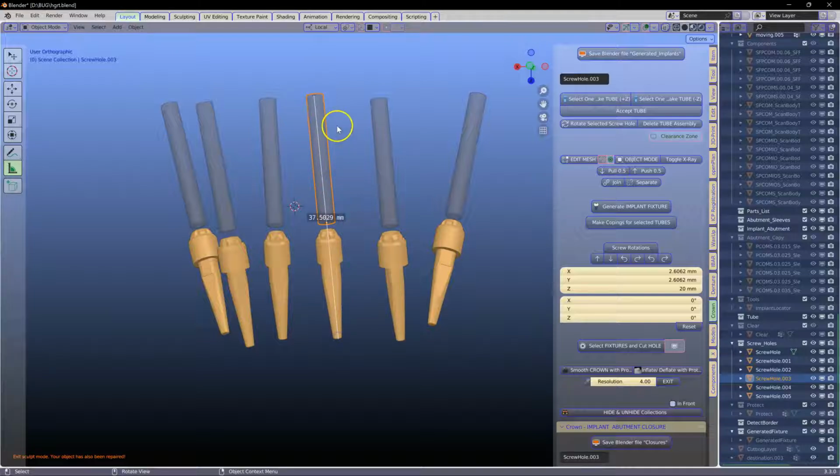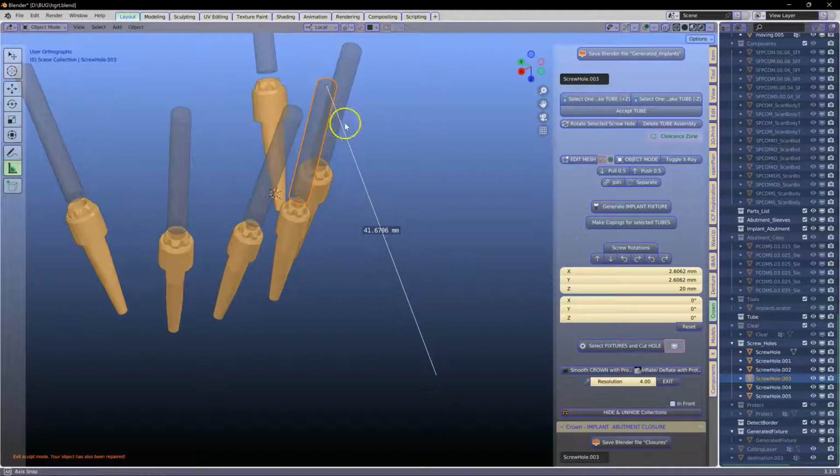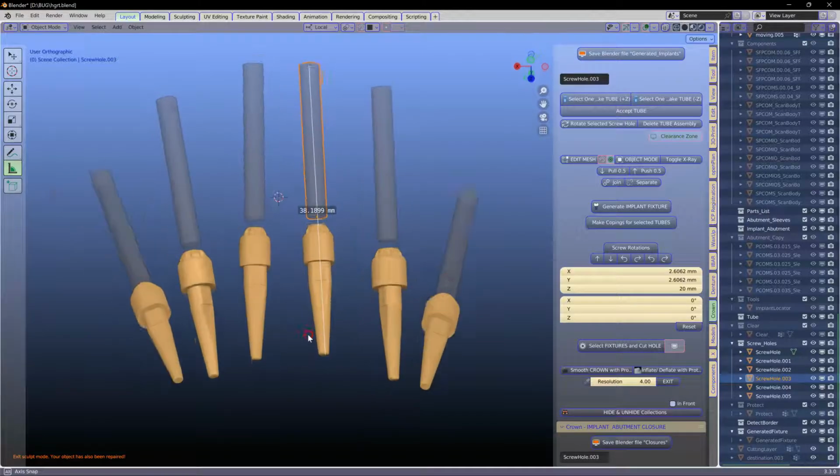Now, if you want to do this type of work, you'll see if I look at it from the view, this angle is completely stray from my object. Simply left click on this, and now we're going to drag this with the control key down, and notice how it snaps to exactly where we want it. And that only happens when you select it, control key down, left mouse down, and all the way down to where you want it to be.